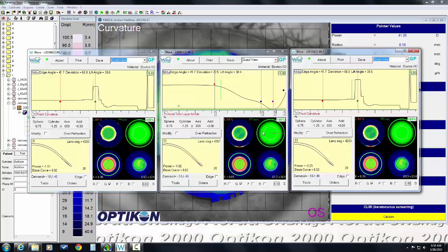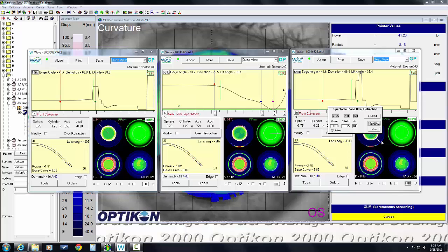To appropriately accommodate rotation of a lens, it's not the axis of the refractive error. In fact, I'll put that back to the way it was originally just for record-keeping purposes, and instead change the axis of the overrefraction. Now we apply the LARS formula: left add, right subtract. In this case, it's rotating to the right, so we would subtract 20 degrees from the axis of the overrefraction.